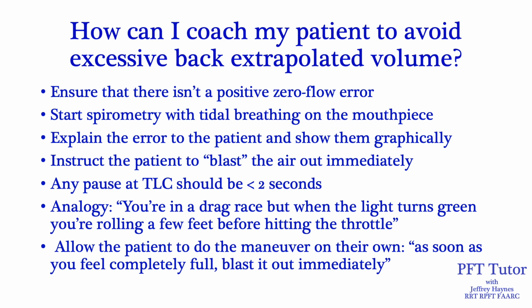If you have identified that excessive back extrapolated volume is present, what can you do to coach your patient to eliminate this error? Well, firstly, you want to ensure that there isn't a positive zero flow error. I think you should have the patient always start spirometry tidal breathing on the mouthpiece. When the patient holds the mouthpiece in their hand, takes a full breath in, and then tries to put the mouthpiece in their mouth, they may have difficulty doing that, and some air leaks out. So I always think it's better to start with tidal breathing on the mouthpiece.